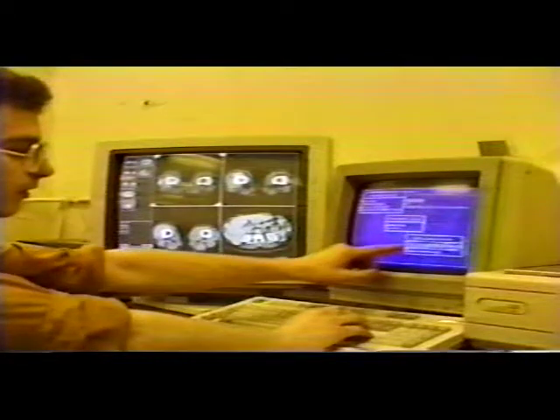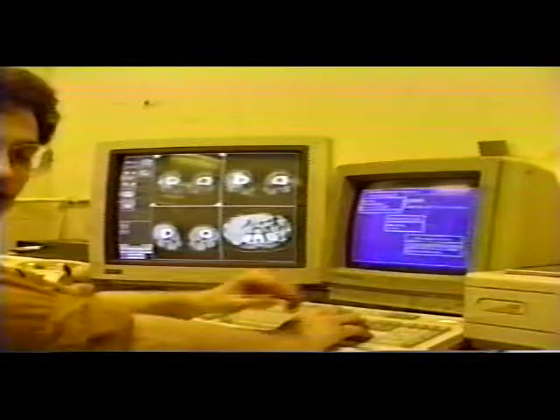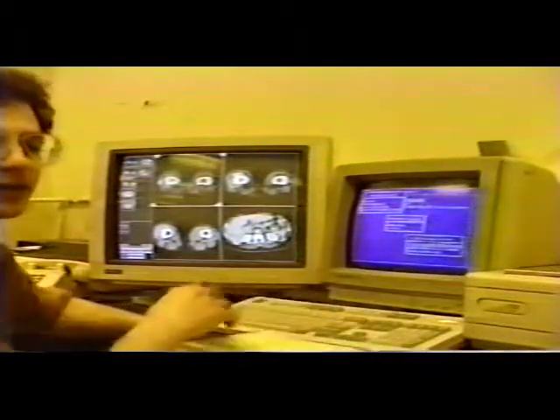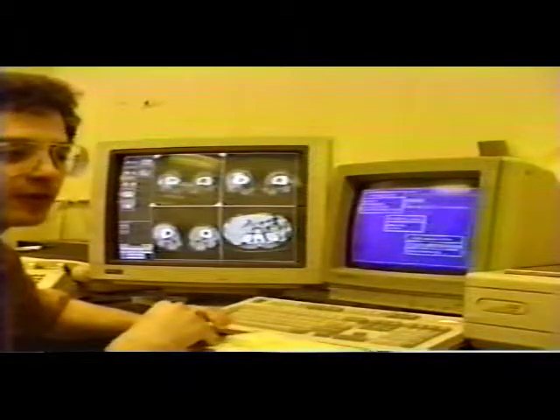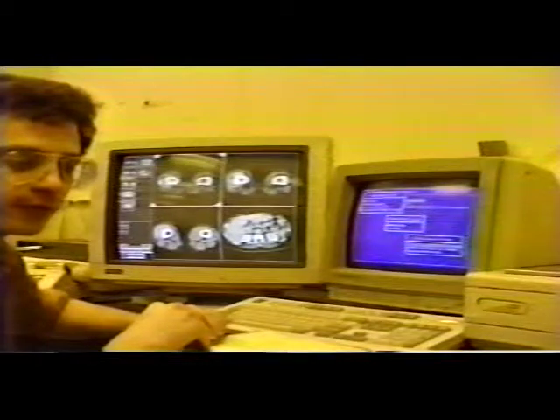And then you can choose whether you want to print the current version only, the current version and all the changes that led up to it, or the first original version only. And this is because we are using a write-once optical disc. We're actually using a file system which I developed for this project.